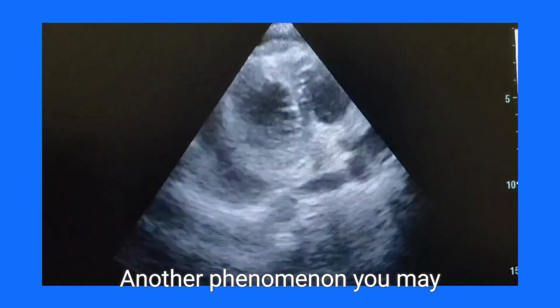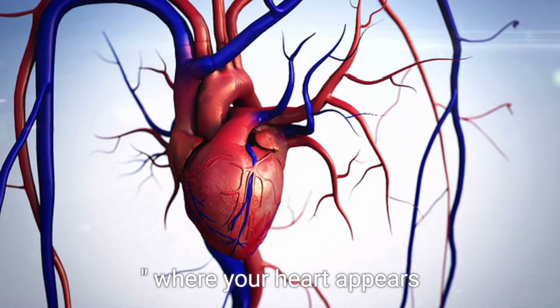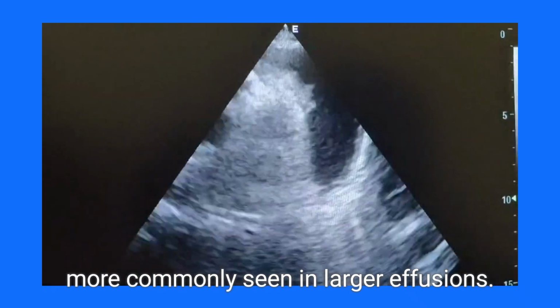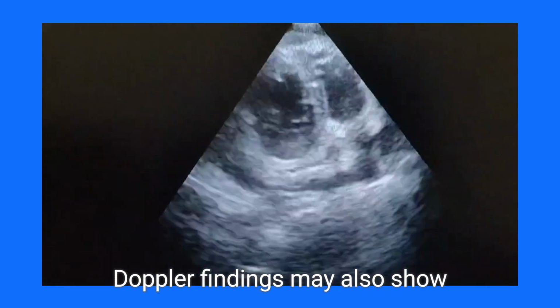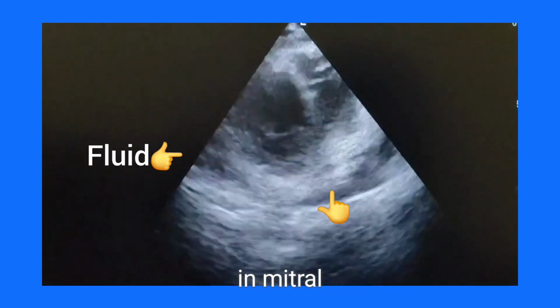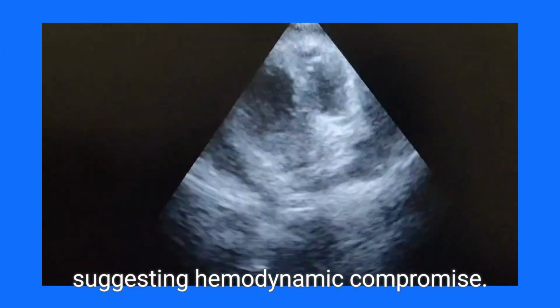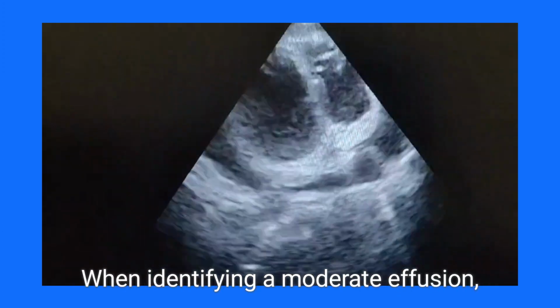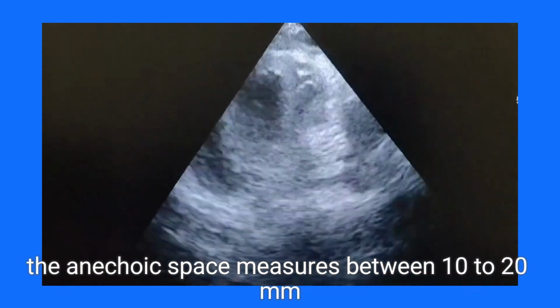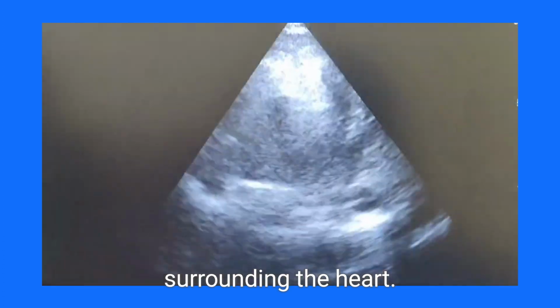Another phenomenon you may notice is the swinging heart, where your heart appears to move within the fluid, more commonly seen in larger effusions. Doppler findings may also show respiratory variations in mitral and tricuspid inflow velocities, suggesting hemodynamic compromise. When identifying a moderate effusion, the anechoic space measures between 10 to 20 millimeters and is circumferential, surrounding the heart.